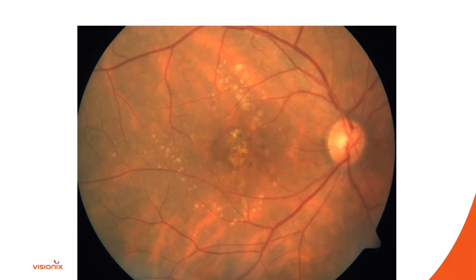So again, here's another patient of mine. And again, you take a look here, and again, I'll just give you a couple of seconds to digest this macula. And in this patient in her 70s, are we dry? Are we wet? We're going to take a look. Do we see any blood? Do we see any hemorrhages? Do we see any edema, any elevations, any presence of maybe a choroidal neovascular membrane?